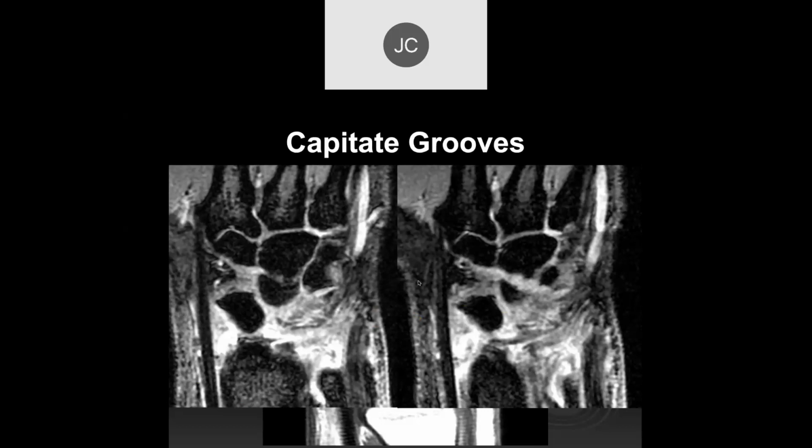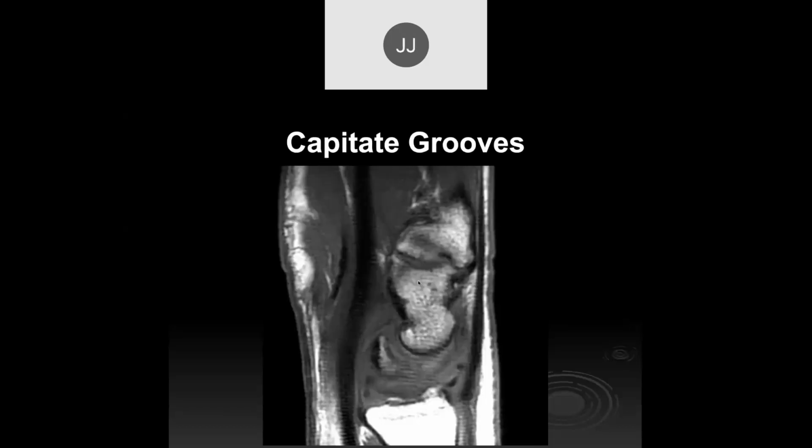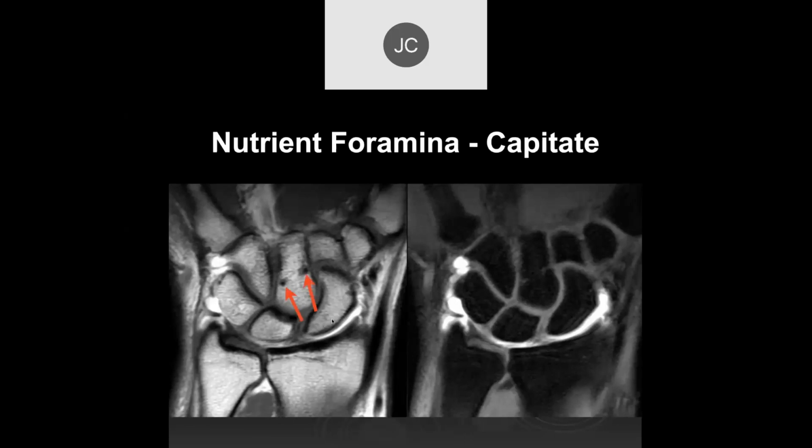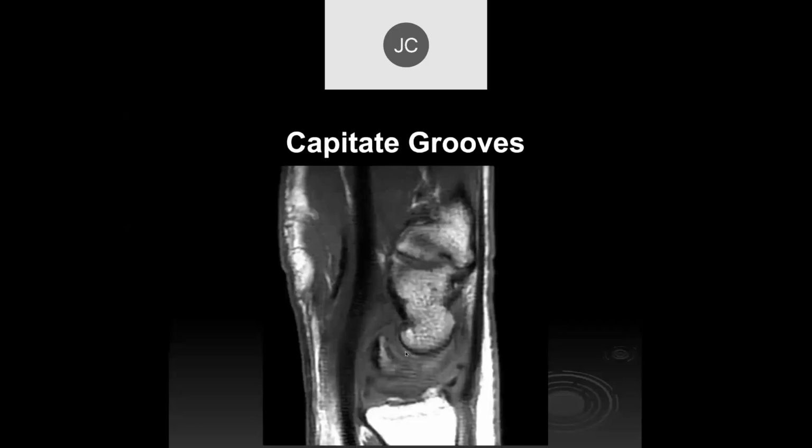Well, the proximal row is very much gone, isn't it, John? Here? You mean on this one? Yeah. Not on this one right here. Yeah. Well, this is a cut in between the lunate and scaphoid, so we're in between the bones. Like I said yesterday, we don't have prosthetics that work very well. They last for a while, but most of the time they wind up with a fusion of the wrist.